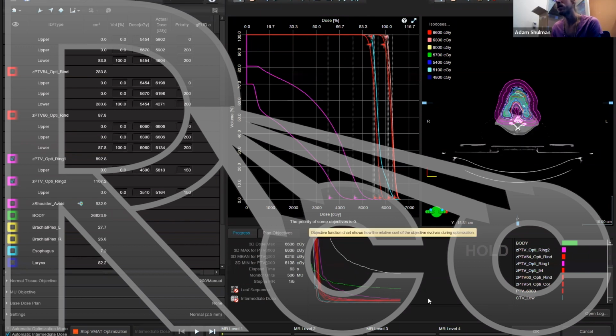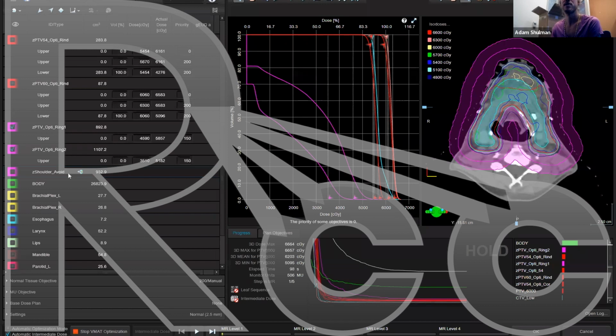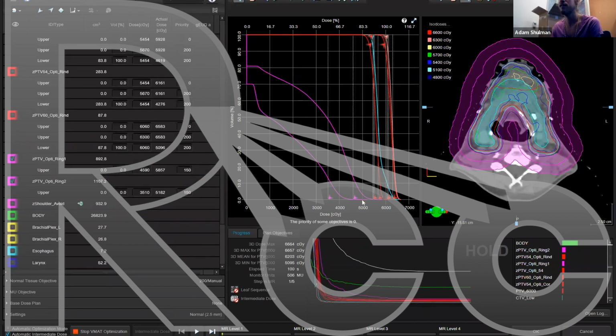And this is our error function. And so it looks like it's starting to flatten out. So in any optimization, you want to wait till any parameter adjustments that you've made begin to flatten out, that the optimization has done about all it's going to do. And then you can move on and input the next value. So it's already flat. I paused it before we move on to the next stop. I'll do most of my optimization early on. This is where I get big MLC motion. So I want to do most of it here. So there are two things that we're going to look at. So I'm going to start one, you can get an idea of what your rings look like.